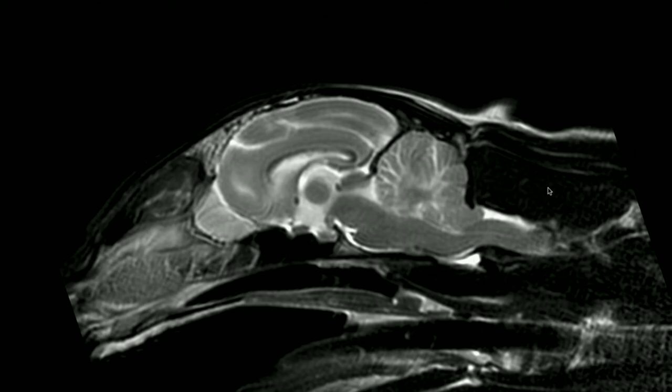It's important when we have mass lesions to assess for the secondary effects. The sagittal T2 weighted image is very helpful for this. In this case, it shows foramen magnum herniation. We have caudoventral herniation of the cerebellar vermis through the foramen magnum, which is compressing the brainstem, which is displaced ventrally here, with attenuation of CSF in the basal cistern. The dilation of the ventricular system that we saw would be consistent with early obstructive hydrocephalus.